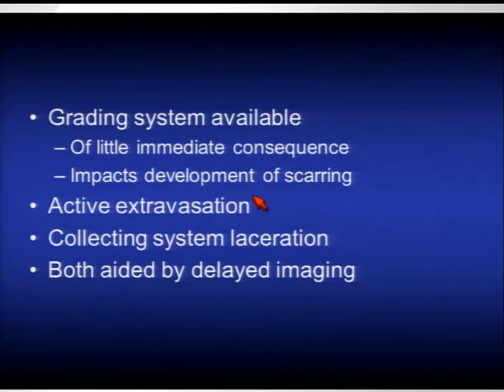What's again important in the kidney is the presence or absence of active extravasation of contrast, indicating vascular injury requiring immediate management, and alternatively, that which results in morbidity, which is the collecting system laceration. And both of these are aided by obtaining delayed imaging.